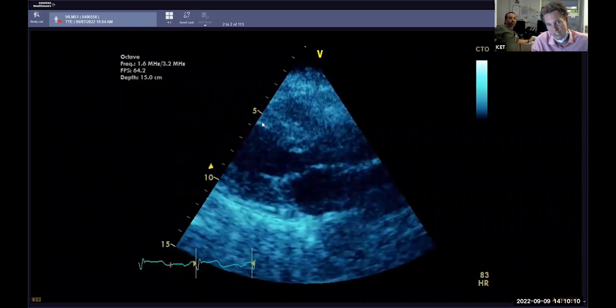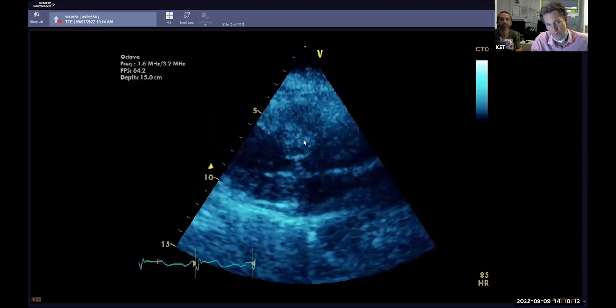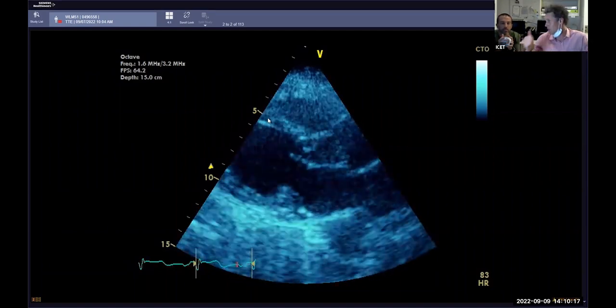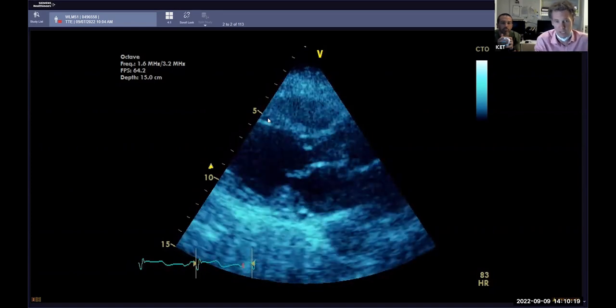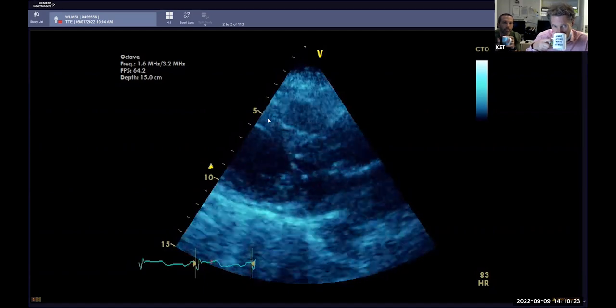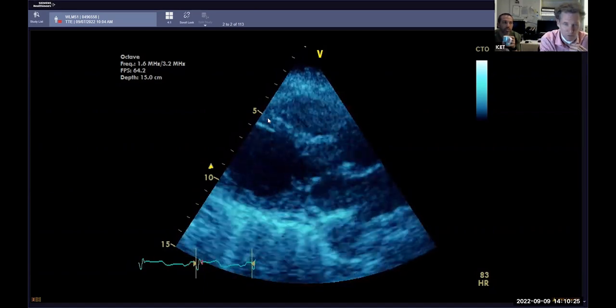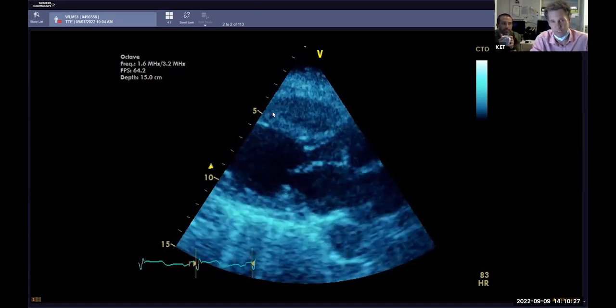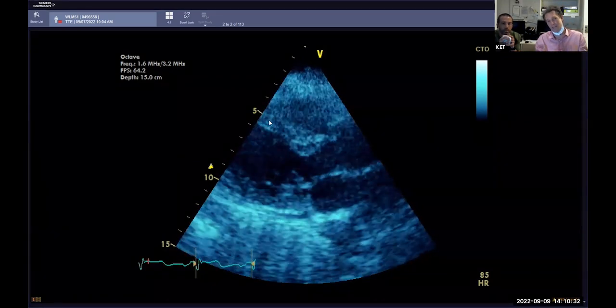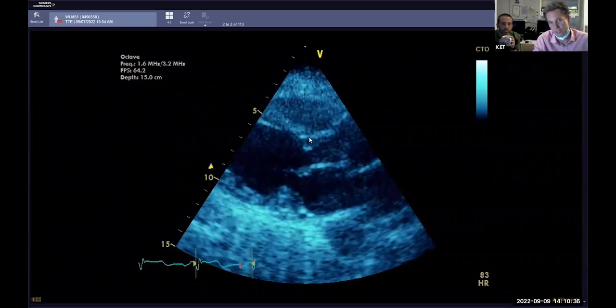And the mid one you can see is not thickening even close to as much as that one. And I'd say that is thickening normally, and that is not thickening at all. What's normal thickening? Greater than 40%. Yeah, well, I say 50, yeah, fair enough. And what's hypokinetic? Between 40 and 20. And akinetic is less than 20 or 15. Yeah, 15 or 10. And that one is clearly not moving. So we've got akinetic mid segments and normal thickening of the basal segments, okay?